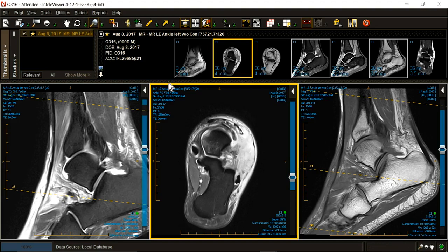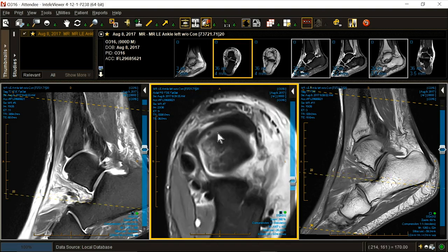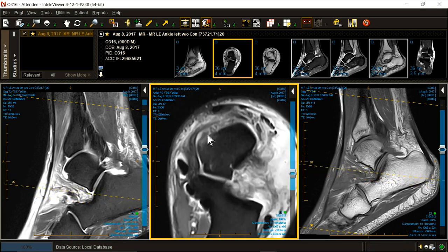We said there was no macrofracture. Maybe that's an incorrect statement. Maybe a tiny depressed macrofracture right there. If you called it a microtrabecular fracture, I think that would be more appropriate, just because of how small it is. Is there a tiny cortical chip there? Perhaps. We didn't CT him.